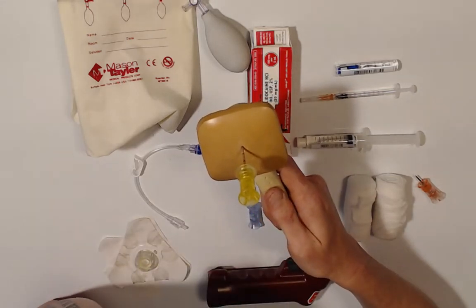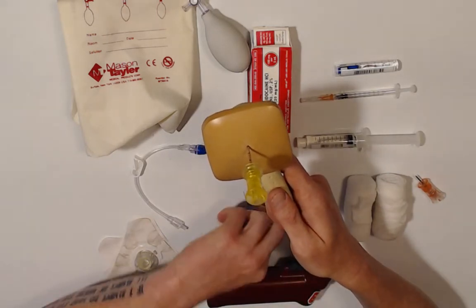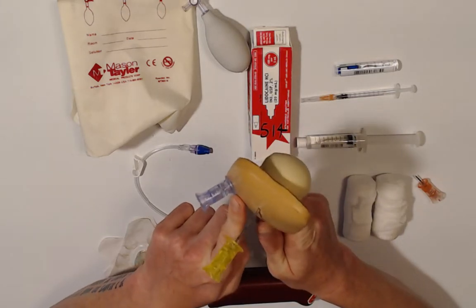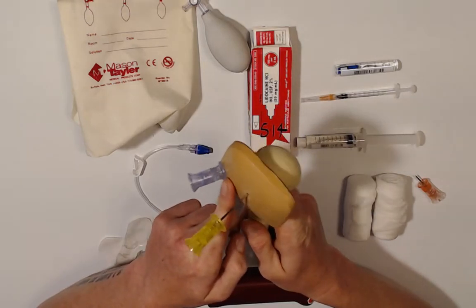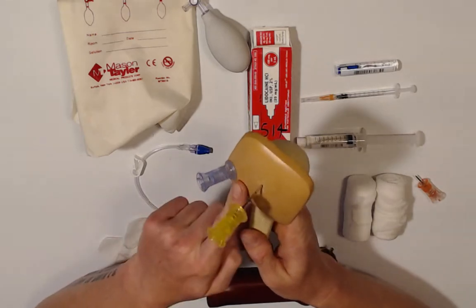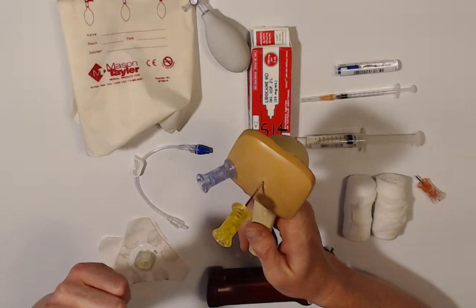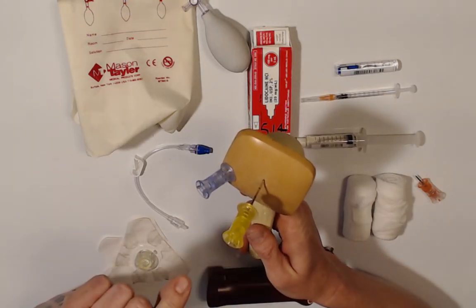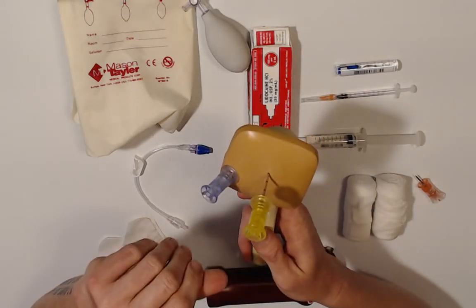Now, when we drill these IOs, your goal should never be to put the hub all the way to the skin. Now for adults, if you're going, let's say in a tibia, might we get the plastic to the skin? Of course, absolutely, you might. But if that's your go-to every time, when you do a pediatric IO, I guarantee if you bury that thing, you're either going to put the end of that needle in the other side of the bone or go completely through and through. Which then of course you're not going to be any good.